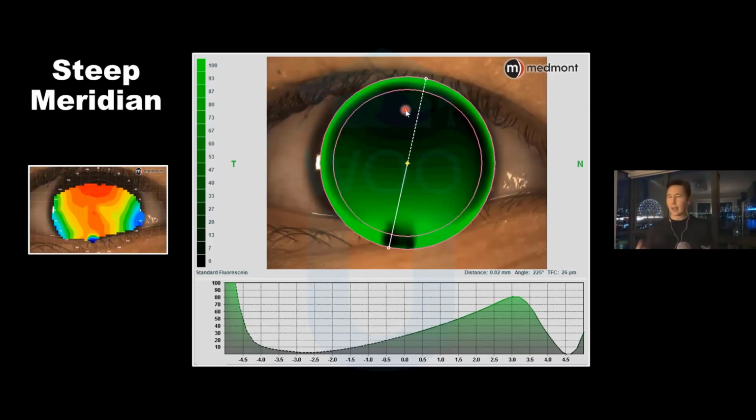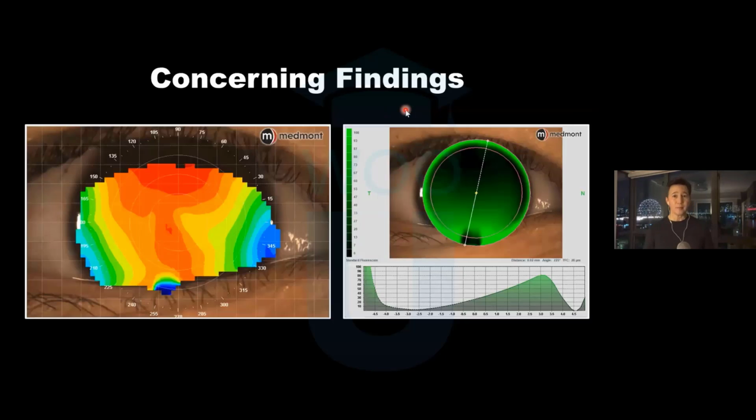It's just, this data is so poor that we really need to edit out those points. So these are the kind of things you want to look for before you send these maps into the WAVE software, so that when you construct, you're building the ideal parameters for the actual shape of the eye.